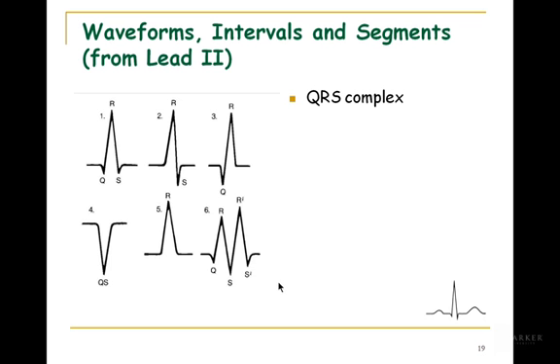If the duration of the QRS complex is abnormal, one of the things it can be used for is to evaluate conduction through the bundle branches or the Purkinje system. I mean, bundle branches are part of the Purkinje system, since the Purkinje fibers allow the ventricles to depolarize at such a very fast rate. So if you've got problems with conduction within the Purkinje fibers, the QRS complex may be prolonged. In a later lecture we'll talk about voltage.